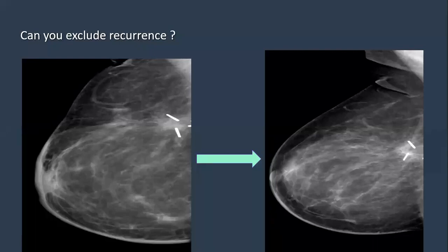Yes, it means there is an underlying mass effect. Something is growing. I have to take it seriously. Not necessarily, this could be post-radiation change. It will regress with time, and this growing lesion is not enough to cause much edematous change. So I have to take all features together, not only look at the edema of the breast and skin resolving. That does not mean everything is resolved. I have to look at the area of asymmetry at the scar sites and analyze it.